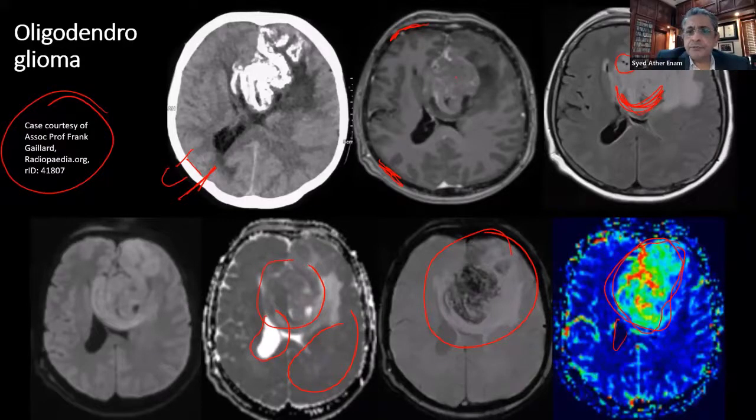Okay, so this is according to the data that I have from Radiopaedia. It is a 60-year-old female with extensive FLAIR abnormalities, crossing the corpus callosum and patchy contrast enhancement. You see this patchy contrast enhancement over here, and marked elevation of CBV, right? MR spectroscopy, not shown, showed an elevated choline peak. I'll tell you about that in a while. Okay, so let's move on.